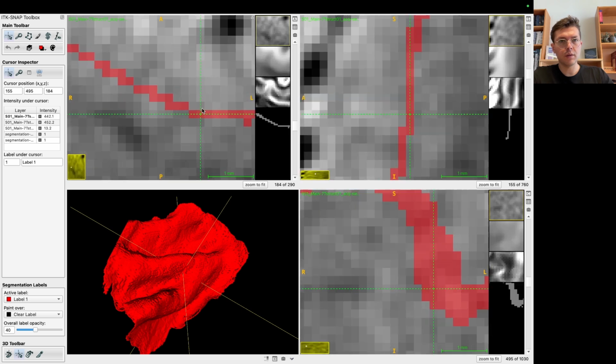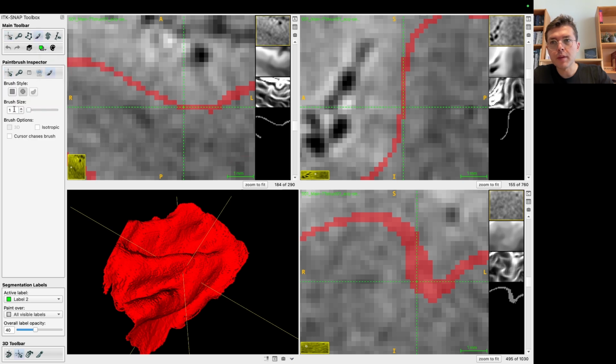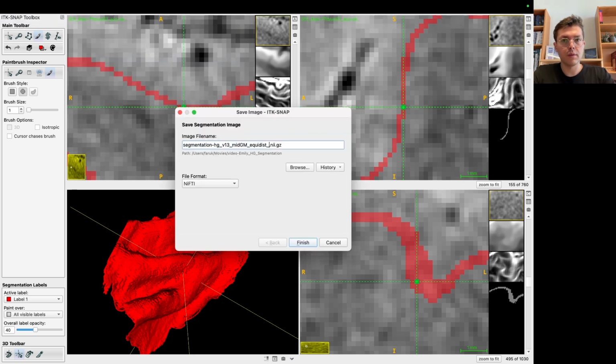Okay, here. Now I will put again the green guy. I don't know why it does it. This is a new behavior. ITK Snap is getting worse, I have to say, and that's why I'm developing my own software, because I think for some reason they are getting worse and worse at each version, for what I use. Maybe other things are getting better.